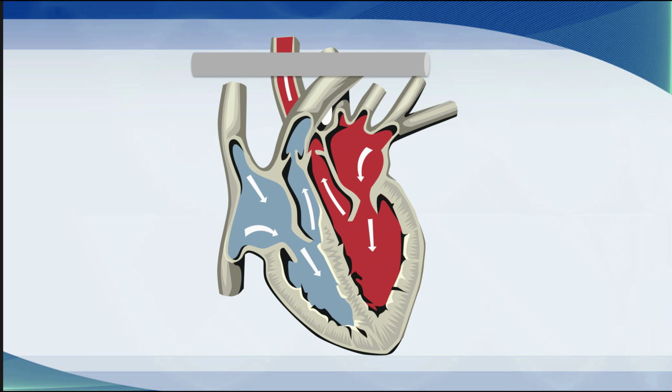It goes all the way through the right side of the heart into the main pulmonary artery and then lodges in a distal segment of the pulmonary artery with the aid of a balloon. This allows us to measure several things: central venous pressure on one side, pulmonary artery pressure on the other side, the wedge pressure where we measure what is thought to be the left atrial pressure by a column of blood when the balloon is inflated, mixed venous oxygen saturation and core temperature. We can also do thermodilution to measure cardiac output.